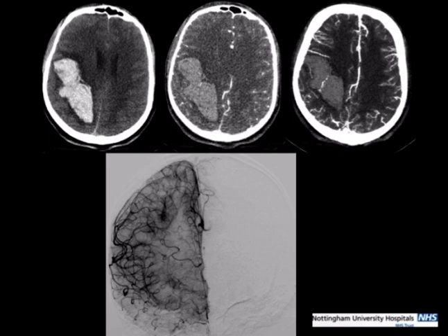So obviously there's a big hematoma in the parietal lobe, subcortical white matter. It's not really a typical location for a traumatic injury, and obviously because it's a child and it's very likely to have an underlying cause outside of trauma, we went on to CT angiography. This is the raw data from the scanner at 0.625 millimeters, which is how we acquire our CT angiography. And it's very easy to miss high density within the hematoma on that, unless you actually do a MIP.